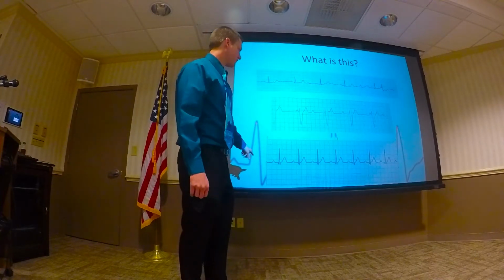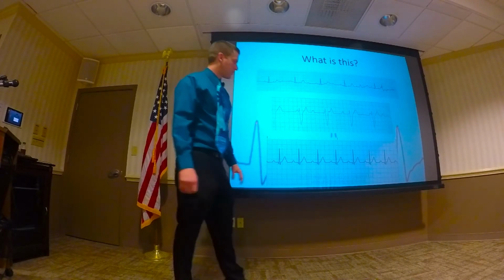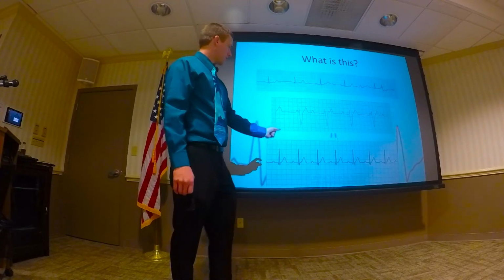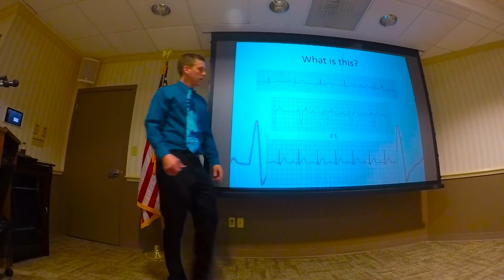So what do we have here? P, QRS, P, QRS. Do you see any dropped beats? No? It's regular. And the start of the P to QRS is more than one big box. So that is first degree.